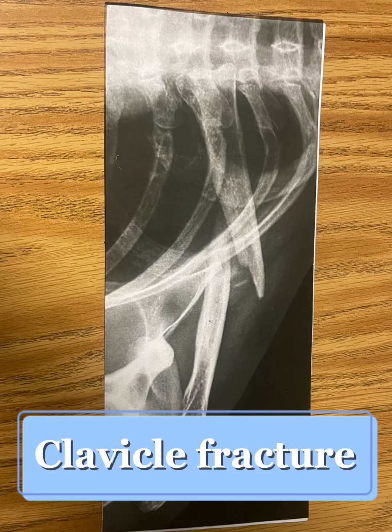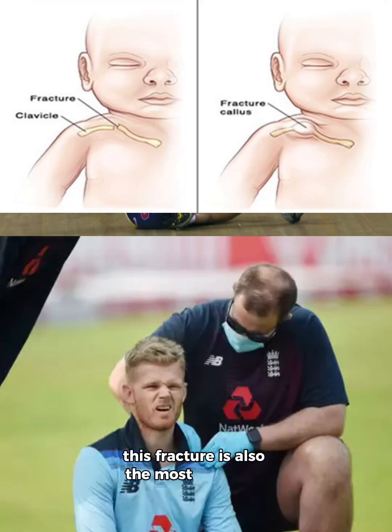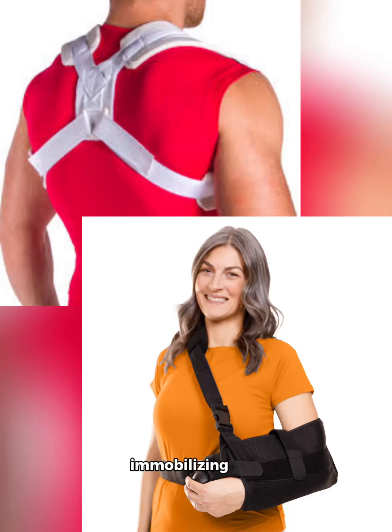This x-ray is a clavicle fracture. A common sports injury, this fracture is also the most common injury to a child during birth. Treatment usually involves immobilizing the corresponding arm with a brace or sling.